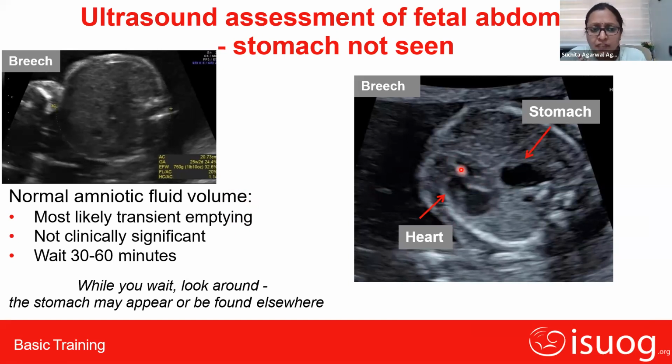We also went back to her previous ultrasound reports because she had done all the scans, the NT scan also, her TIFA scan also. I saw all the images, but in none of the images was the stomach seen. In all the images, only this measurement was there, but the stomach bubble was not visualized in any of the images. That means this could have well been diagnosed at least at the time of TIFA scan. So here lies the importance of seeing the stomach at all the scans.